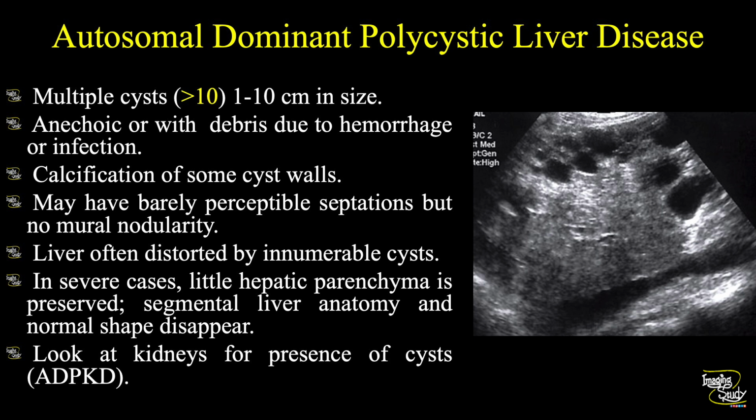In case of cystic metastasis, there will be mural nodularity and thick septation, and the wall will show vascularity. In case of biliary cyst adenoma or cystadenocarcinoma, there may or may not be presence of mural nodule depending on the malignant or benign nature. Usually these are multiseptate cystic mass with the septations having vascular flow on color Doppler. These are common in women with associated dilated biliary tree.